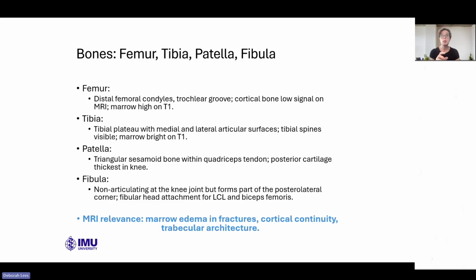And it's really important to look at the fibula head for a number of reasons. One, for those attachments, also because you can get a subluxation and a dislocation of the fibula head. And also if the person has had an ankle injury, we do sometimes get ankle injuries. It's called a Weber C or a Maisonneuve injury, where the force comes across the ankle joint, travels up the syndesmosis between the tibia and the fibula, and then exits out the fibular neck really high up.